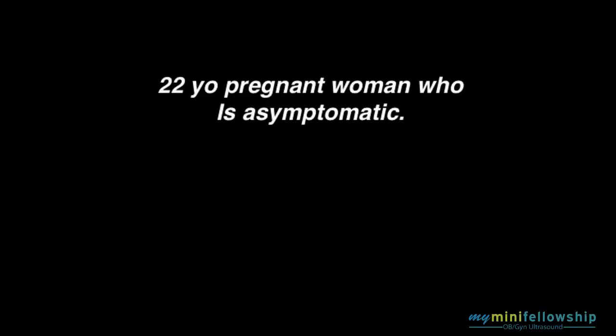Okay, so this first case we're going to look at is a 22-year-old pregnant woman who was completely asymptomatic. Okay. I'll now show you the images.